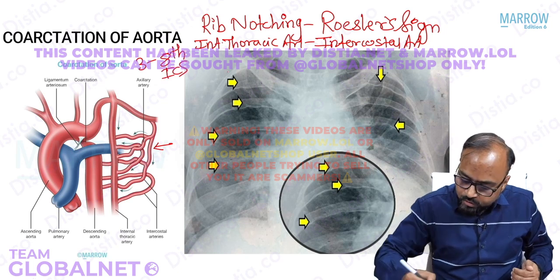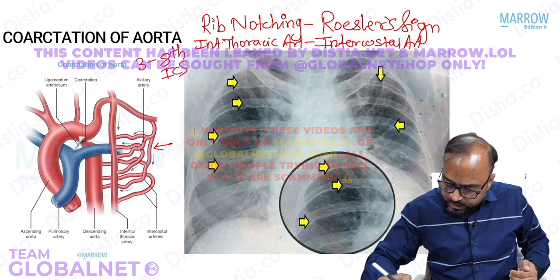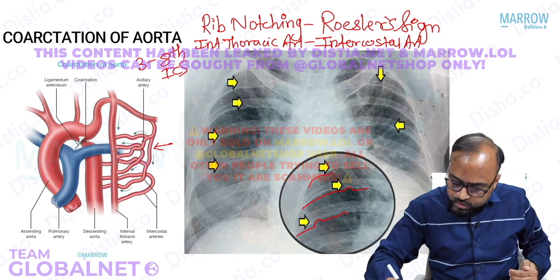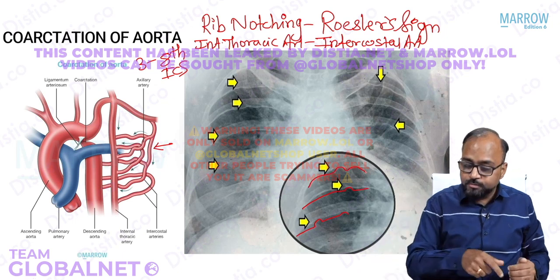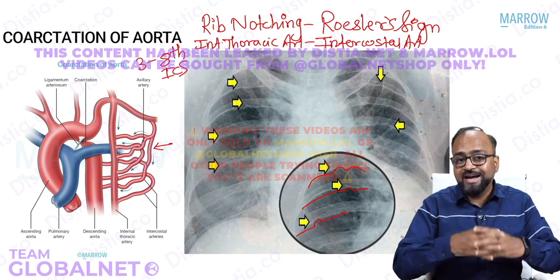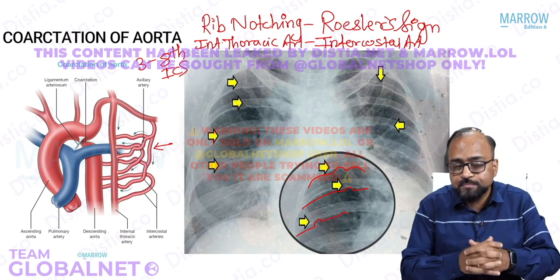If you look at this particular image here, you can see along the ribs these notches along the inferior margins of the ribs. Why? Because once these arteries take part in the formation of the collaterals, these arteries become enlarged, dilated, and tortuous. So what happens?